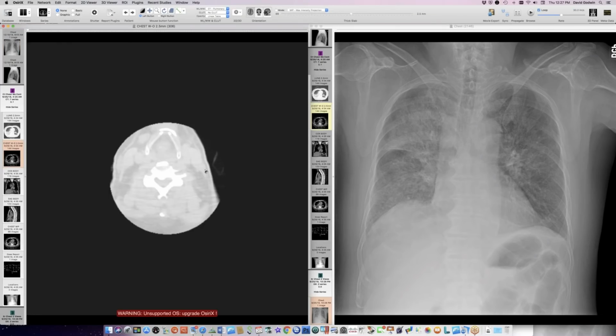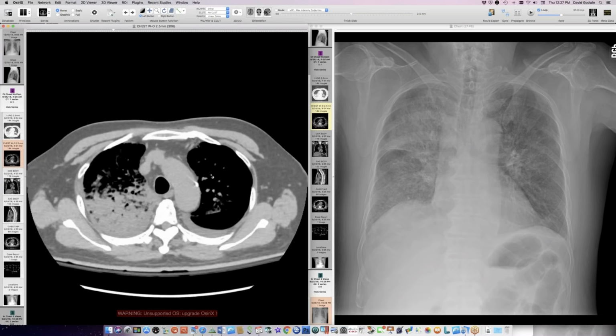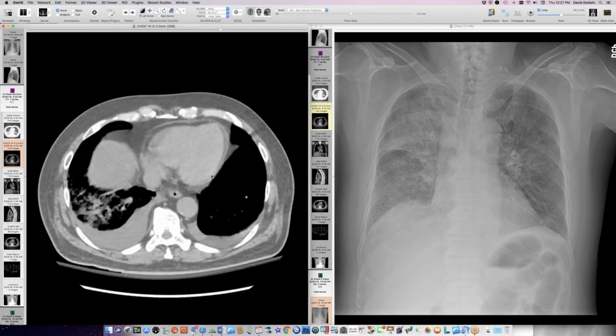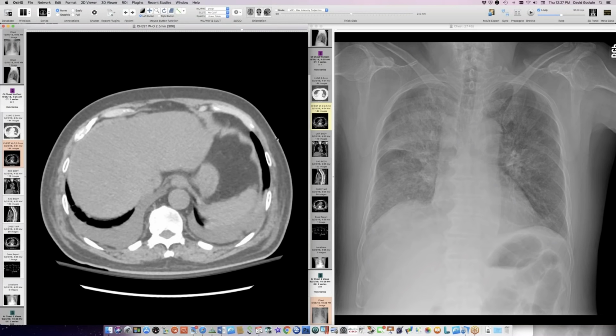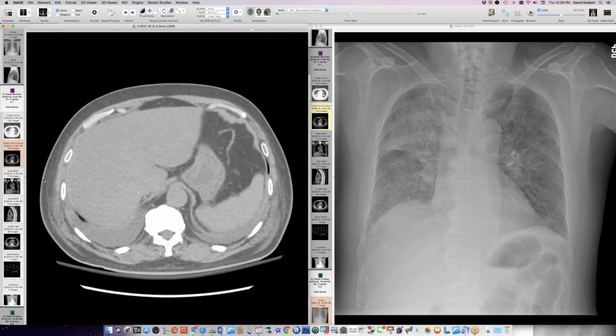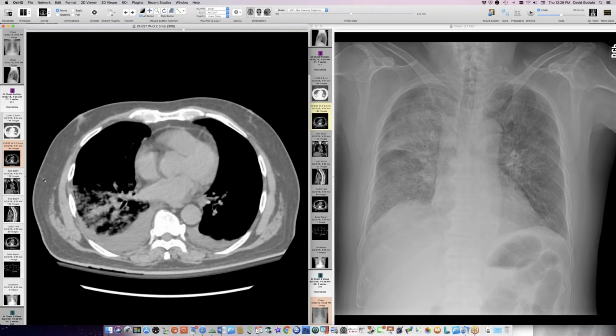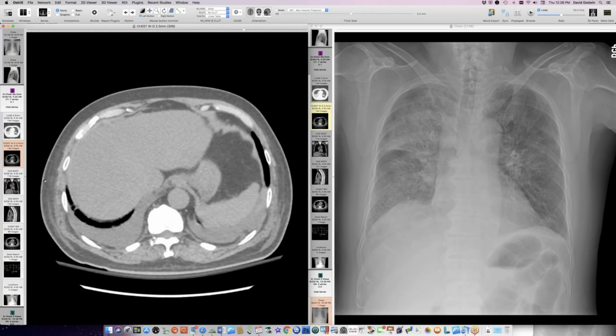And his vascular pedicle is also wider on the original one, around the azygos particularly. Yeah, expanded intravascular blood volume is probably present, perhaps. Do you think he's got some anasarca going down here? Not that impressed with, yeah. There does seem to be some stranding in the fat there. Maybe the hyponatremia had something to do with that. Yeah, he's got a little bit. But it sure looks different, doesn't it? In a short period of time, the thickness of the soft tissues is dramatically different, even bedside versus not. Right. Okay. All right. Very nice.